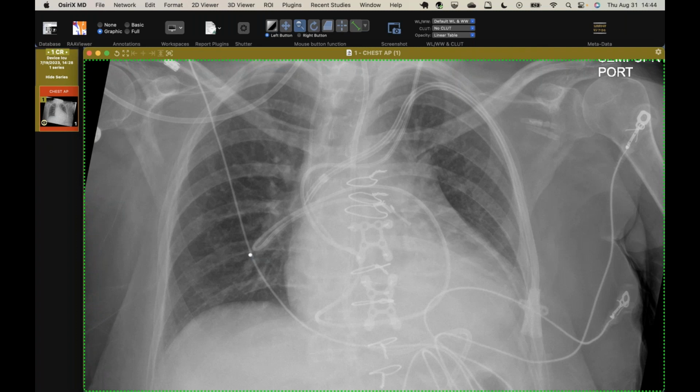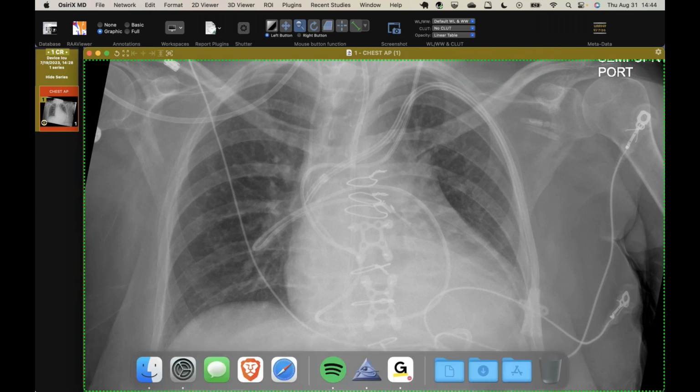Gosh, yeah. Can I take a guess that the patient is a heart transplant recipient? And if I'm correct, I'll say why. Do you know? Yes, perhaps because there's all the sternal wires, yet there's no anything else.